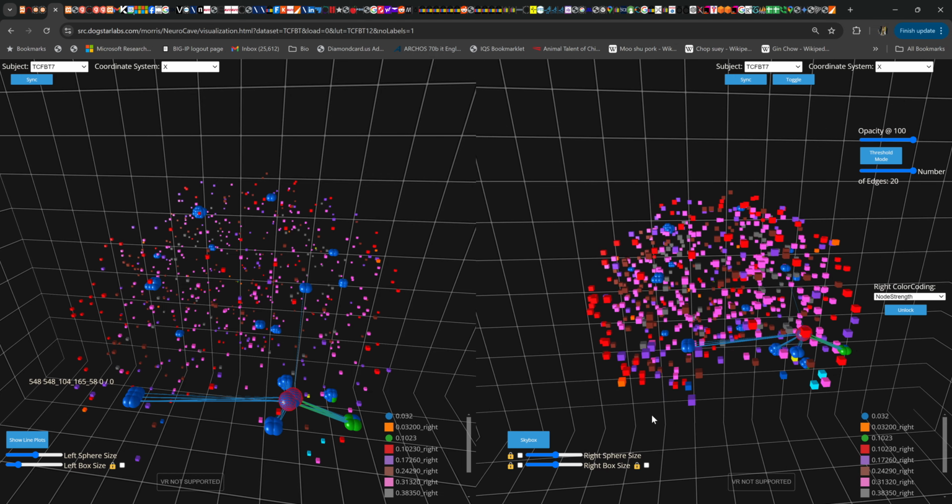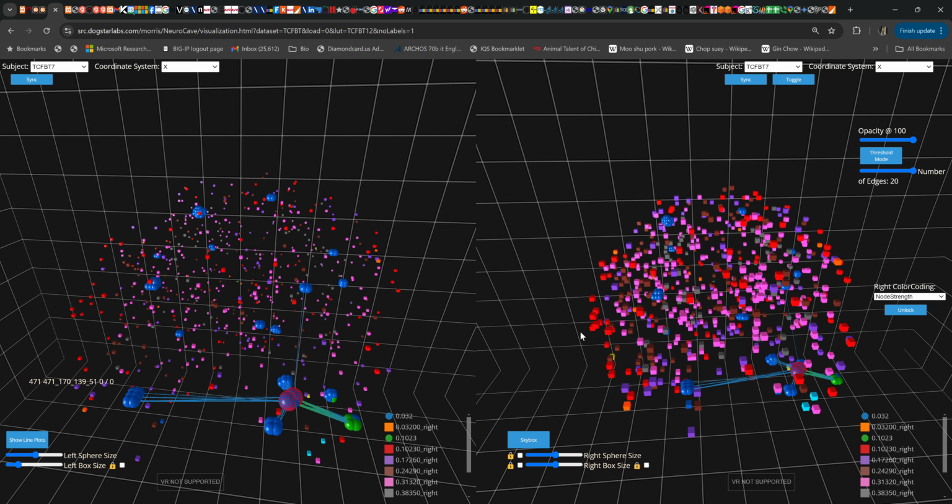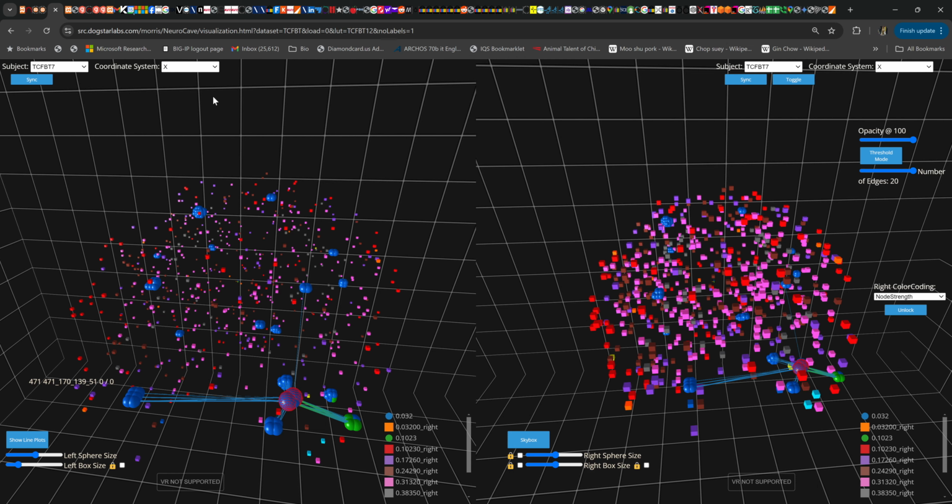It has two linked views, and by default they show the same information, but there are some selection drop boxes that can be changed to configure the different views so that they can be compared. One useful thing would be the MDS transform, a multi-dimensional scaling.